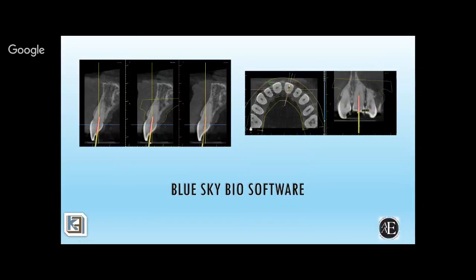So your drilling depth, we try to minimize the amount of drilling depth because the drills that are available are actually short, they're not long enough. So you have to minimize the offset and bring it as close to the drilling point as possible. That will also minimize your deviation as you go deeper and as you put pressure on your drills. And then you make sure from all directions you fit on it mesiolingually and mesiodistally and buccolingually. And in that case, I decided to give it a test drive.